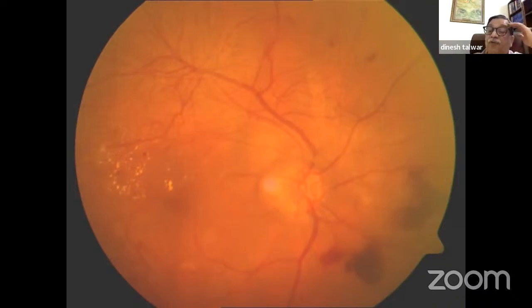See, be very careful because when you make definitive terms, then they say, how are you sure? And then how can you be sure? So then, of course, unless you want to trap the examiner into asking you about stereoscopic examination, so then it's different. If you want to lead the conversation that way, you may say, I'm sure this is macular edema, and he says, why are you sure? You say, well, confirmation is only possible by 90D, but looking at this, I can tell you that. Okay.